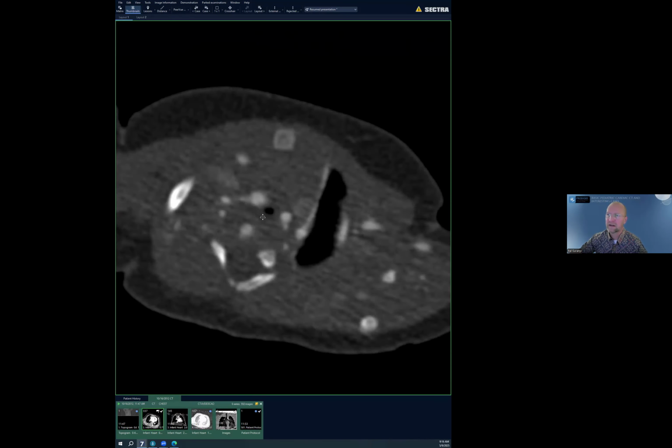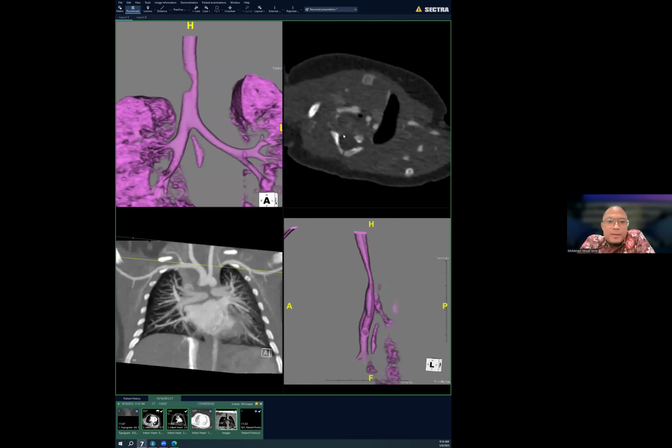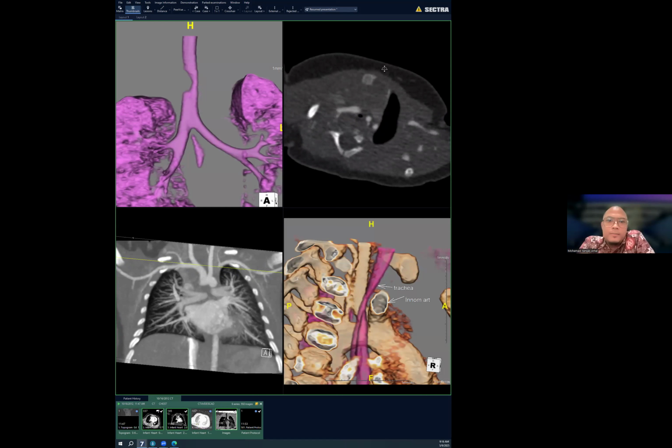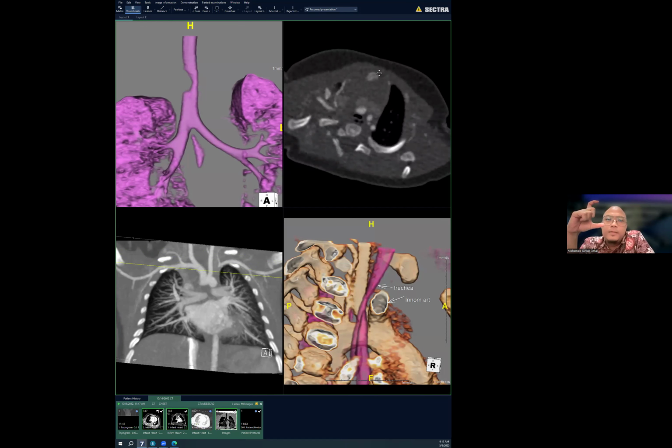Any questions right here? If there are no questions, then I'm going to... Yep, go ahead. I have a question, Prof. Yes. When I look at this patient from the axial image, we can see the distance between the manubrium sternum and the brachiocephalic artery. It's quite big.